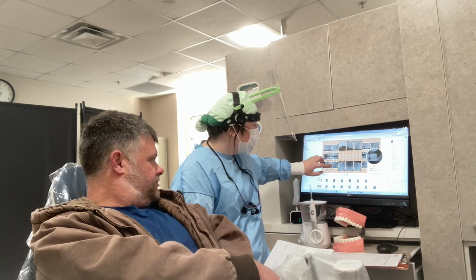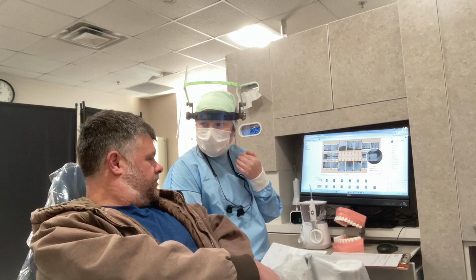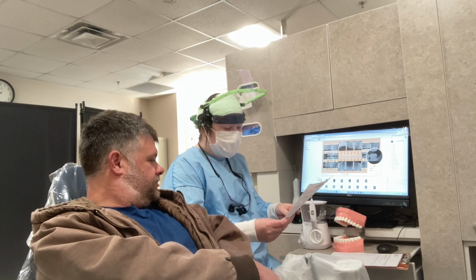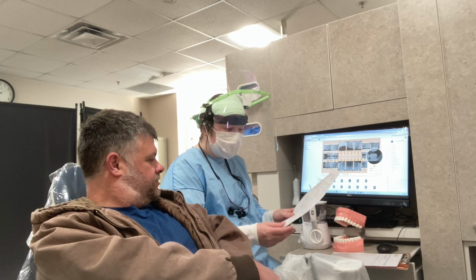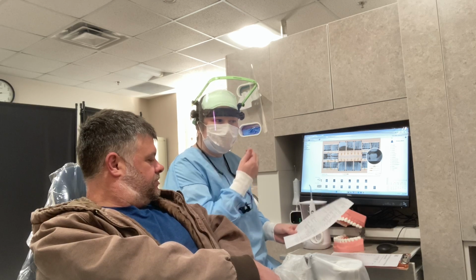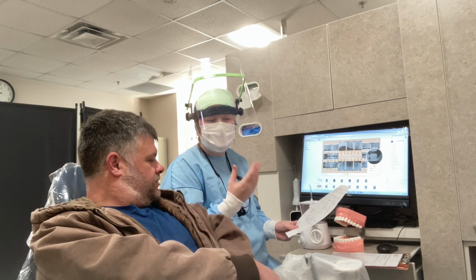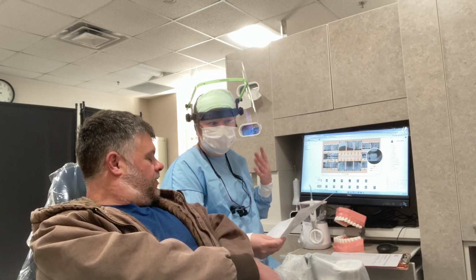If it's a little more radiolucent, then it's only lost on one side and not necessarily the other side. So that's kind of something cool that you can see on the image. Also with the grade C that we have accounted for, we know that we're seeing more rapid bone loss, and that's what that vertical bone loss can indicate, is it's just occurring more fast. So cleaning up everything is going to help tremendously to slow that down.